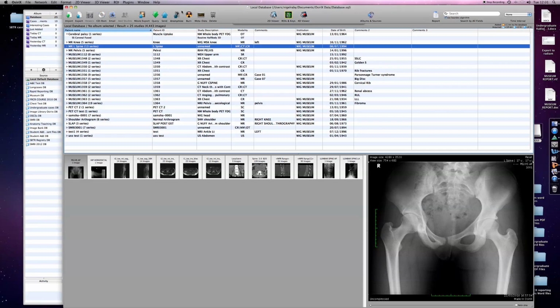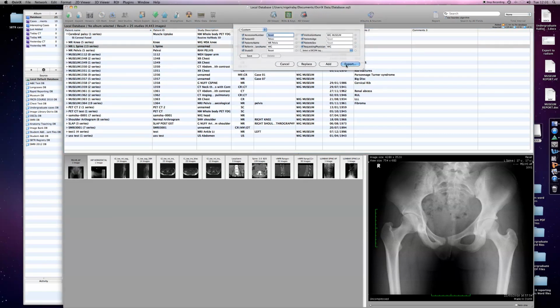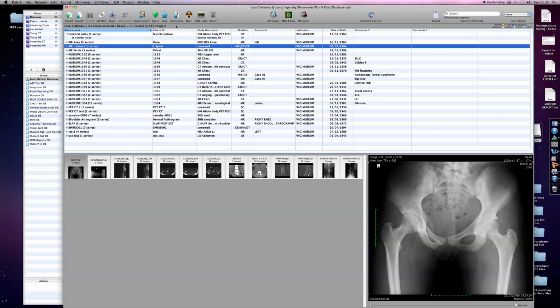The thing we need to fully understand is that the key area we want is plugins. If you highlight plugins at the top and scroll to database, you will see this gives you an option to convert PDF files to DICOM and JPEGs to DICOM. And as OsiriX reads DICOM only, we need to use this facility. So you can see any text or other information we are going to add has to either be in PDF or JPEG format initially.